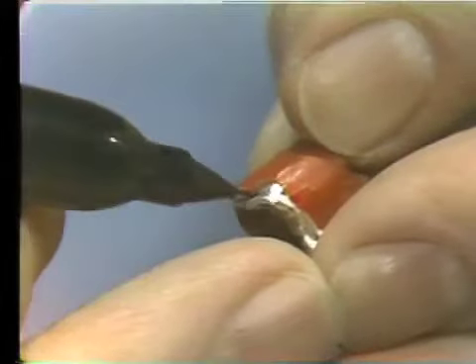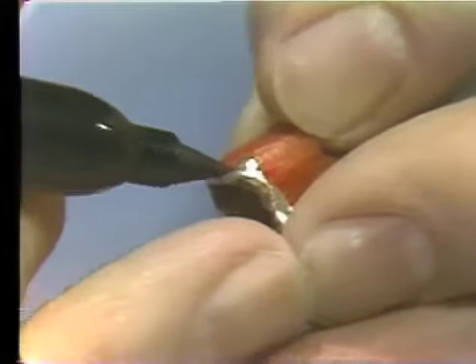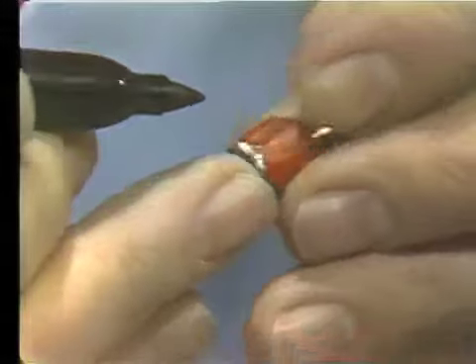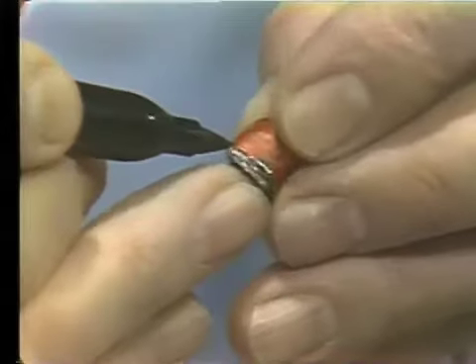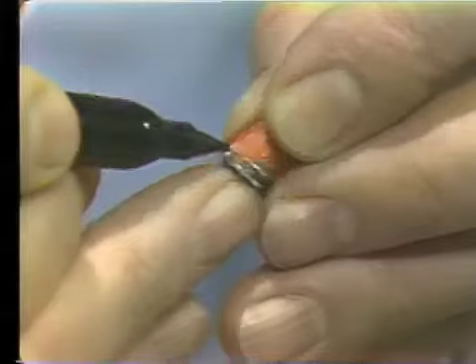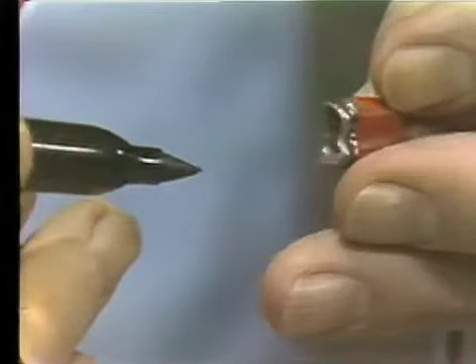Some people would rather undercut this area so the laboratory technician cannot extend the casting into this area, but these are other variations. I would still want to mark this some way for the laboratory man to know where I want the margins. If we leave this to his individual interpretation, he might interpret a different area than we have marked on the die.